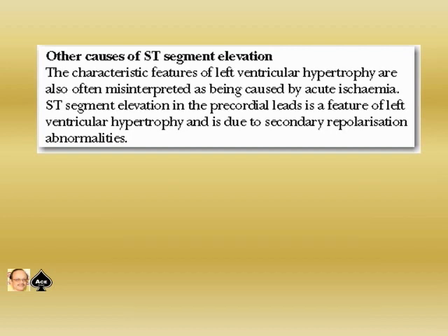Other causes of ST segment elevation: the characteristic features of left ventricular hypertrophy are also often misinterpreted as being caused by acute ischemia. ST segment elevation in precordial leads is a feature of left ventricular hypertrophy and is due to secondary repolarization abnormalities.